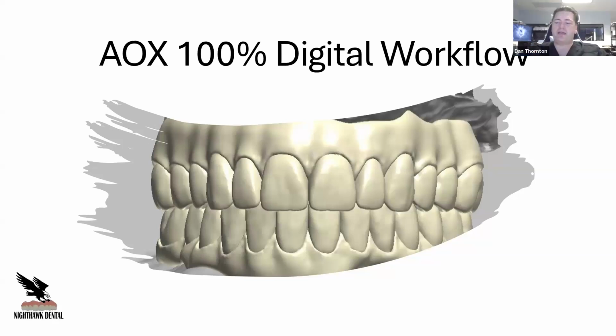Well, thanks for having me back. It was fun last time actually going over the All-on-X conversions chairside. So this is actually even funner. This is what I normally do every day, is more of the 100% digital workflow with photogrammetry and trying to get everything organized, ready to print, ready to mill for the doctor's office so the patient can actually have their teeth the same day of surgery.